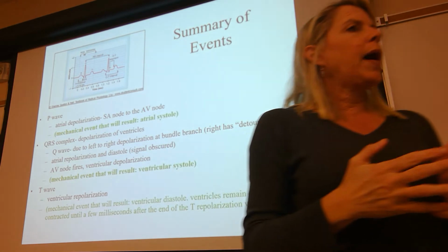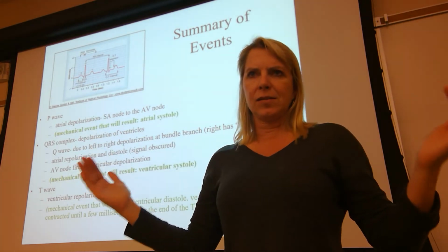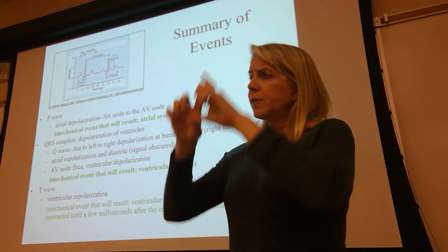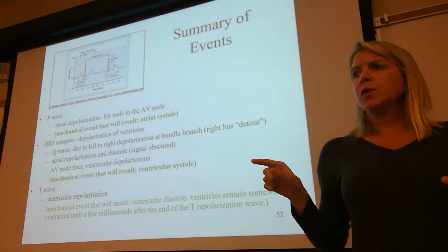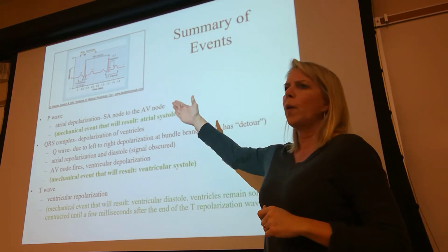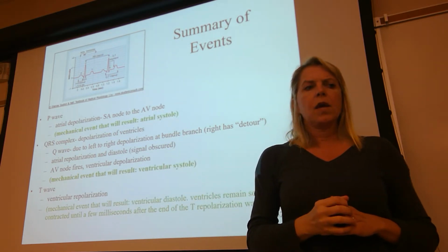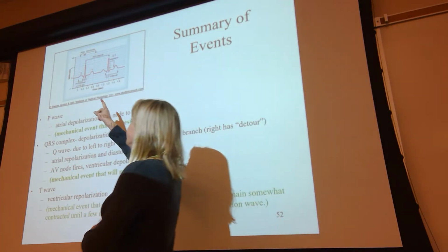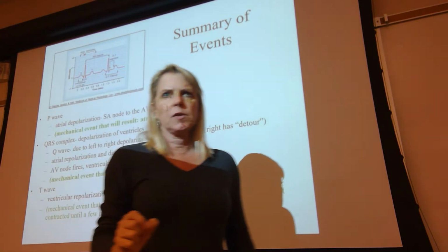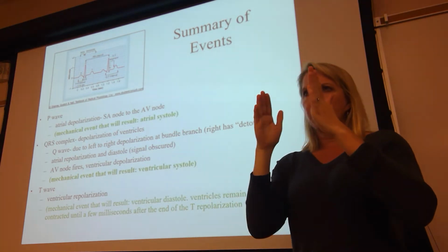I am going to tell you how we can measure the time that the P wave lasts. Here's how you're going to do it. In your lab manual, there's a table in your EKG section where you're supposed to calculate the length and time for these different waves, complexes, intervals, and segments. If you have a ruler and you're measuring for the P wave, you would measure in millimeters the distance of the P wave from where it begins to where it ends.